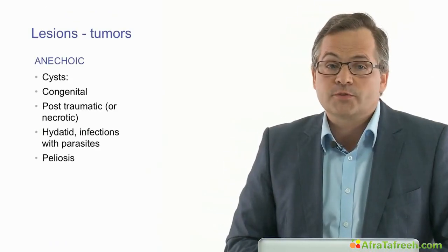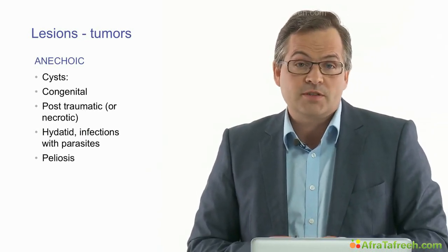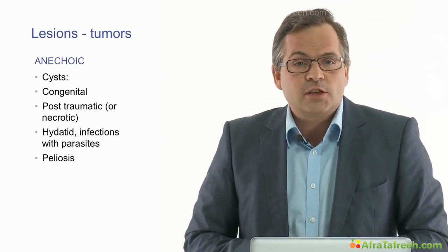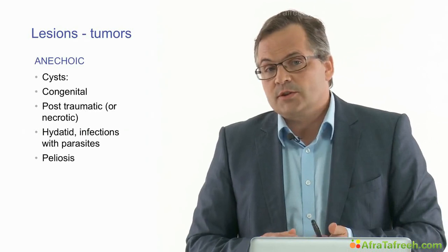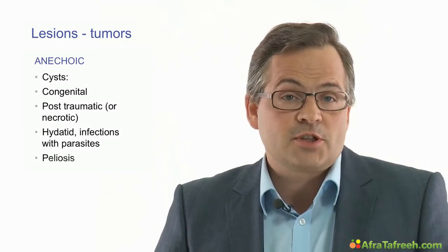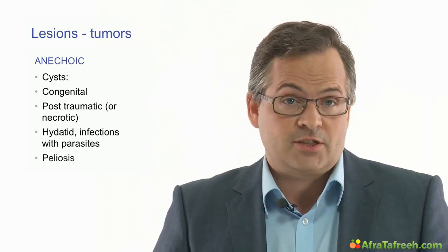Lesions and tumors of the spleen are rare, but any pathology can give us a hint for a maybe severe disease which involves the splenic tissue. Lesions may be cystic or solid, or may entail both structures. Cysts may be congenital or the result of an injury, a necrosis, or an infection.